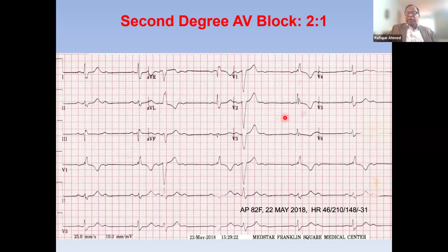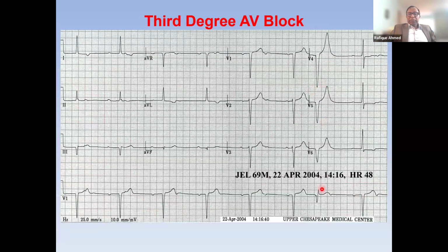We try to avoid putting in temporary pacemakers. But you have to be careful with this kind of patient because they have block of both bundles, left bundle and right bundle. So how about this one?